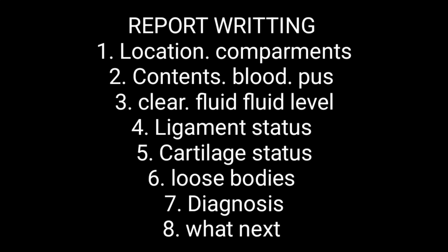While writing the report, your ultrasound report should have all this information. You have to write down where the fluid is and in which compartment this fluid can be seen, what the contents of the fluid are, whether there is any pus or blood or any fluid level. Beside this, also comment on the ligament status, on the cartilage status, and whether there is any loose body floating within the effusion, within the fluid, and at the end you must give your differential diagnosis. First of all, try to write down the exact diagnosis if you are sure, and if you are not, just give three differentials.